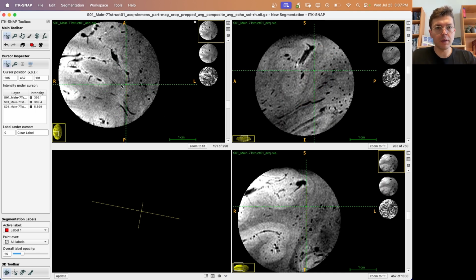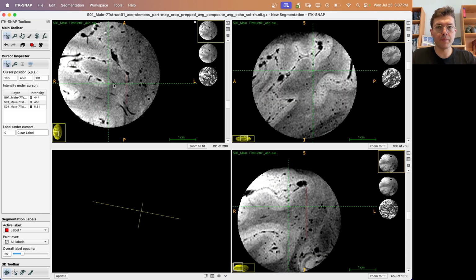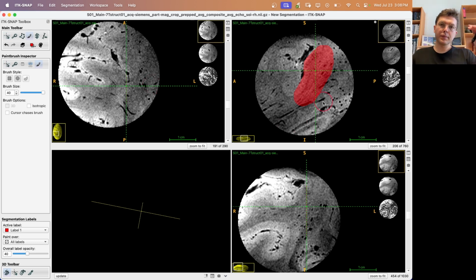Start from here and I'm going to sweep through here within the scoop. But instead of going through every slice, I am going to go every, let's say, maybe fifth or seventh slice, and I will come back to how we work with that later. Just trust me on it for now.